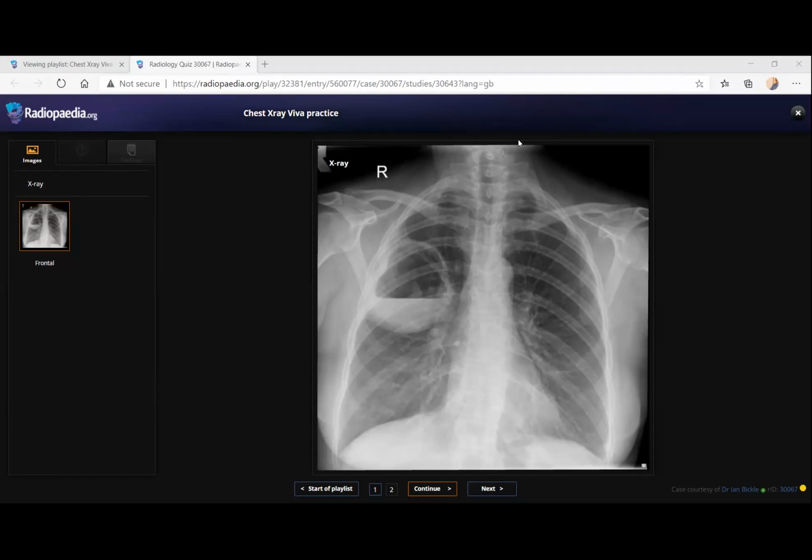I would ask about the clinical presentation of this patient. And the patient presented with a fever and chest pain. Okay, so this would be more suggestive of a lung abscess with a fluid level. I would refer this patient to the pulmonary clinician, and would advise a CT of the chest to delineate the inflammatory process.